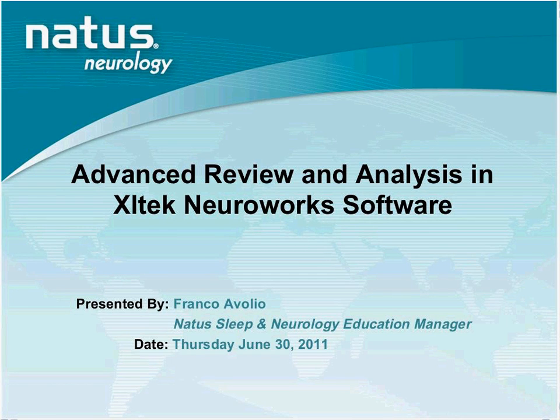The outline today, or at least the topics, I just want to give you an idea of what I'll be covering today. I will be reviewing and demonstrating a few things in the montage that are available. Channel sets. There's a new button in the toolbar called vertical paging, which allows you to display a set number of channels in your window. We'll be looking at some of the trend charts, workspaces, gridlines, and some changes in the annotation viewer. Then I'll be talking about a few additional settings.